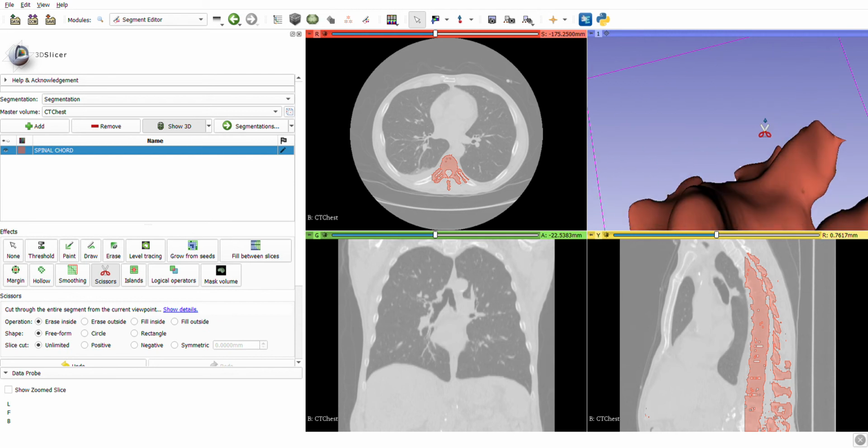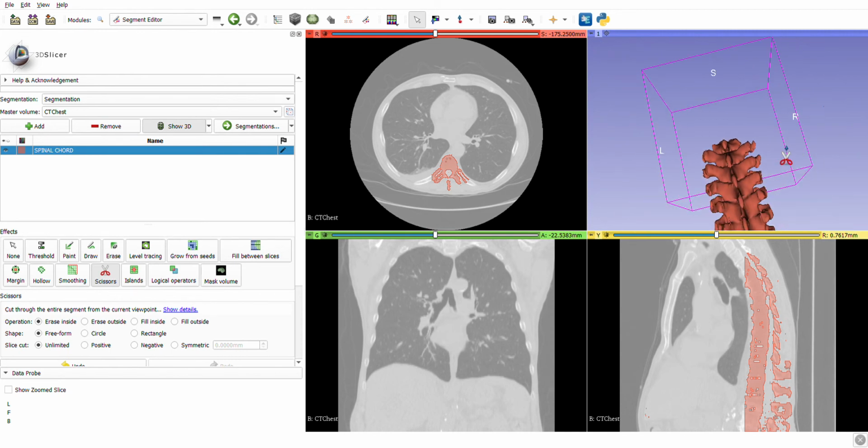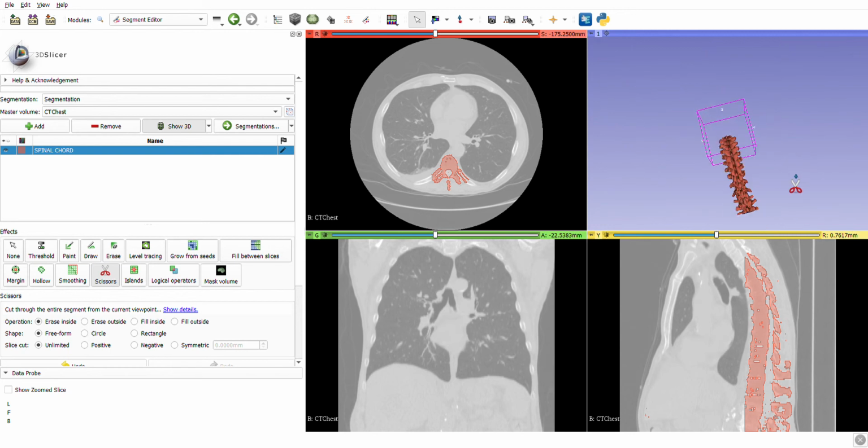You should know the body parts and organs, because whenever you are doing these segmentations or separations, you should have that knowledge, or else you will delete the part which is of interest, and then there is no use of 3D printing that part. So basic knowledge of the human body is definitely required here.